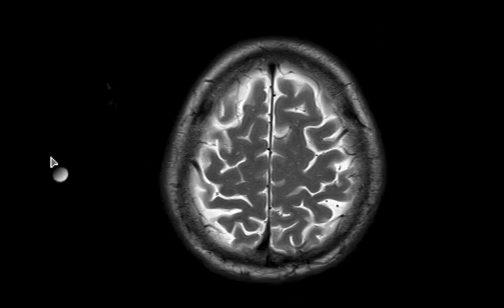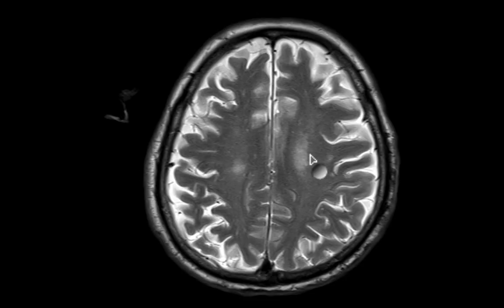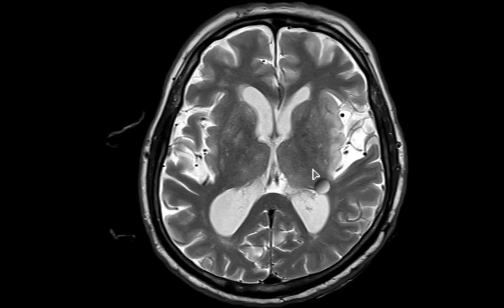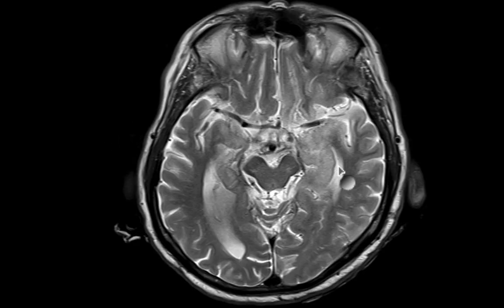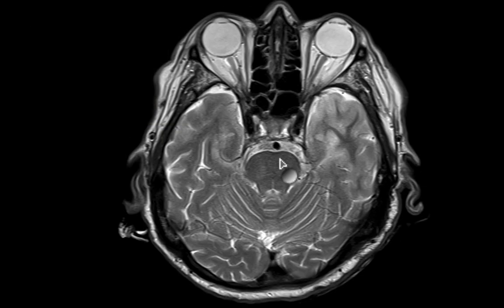Now to the T2 weighted image. There are some patchy changes within the centrum semiovale and corona radiata consistent with microangiopathic chronic findings. However, it's a little bit more clear that you have high signal intensity in the cortical and subcortical medial left temporal lobe, a lesser extent of the involvement of the medial right temporal lobe.